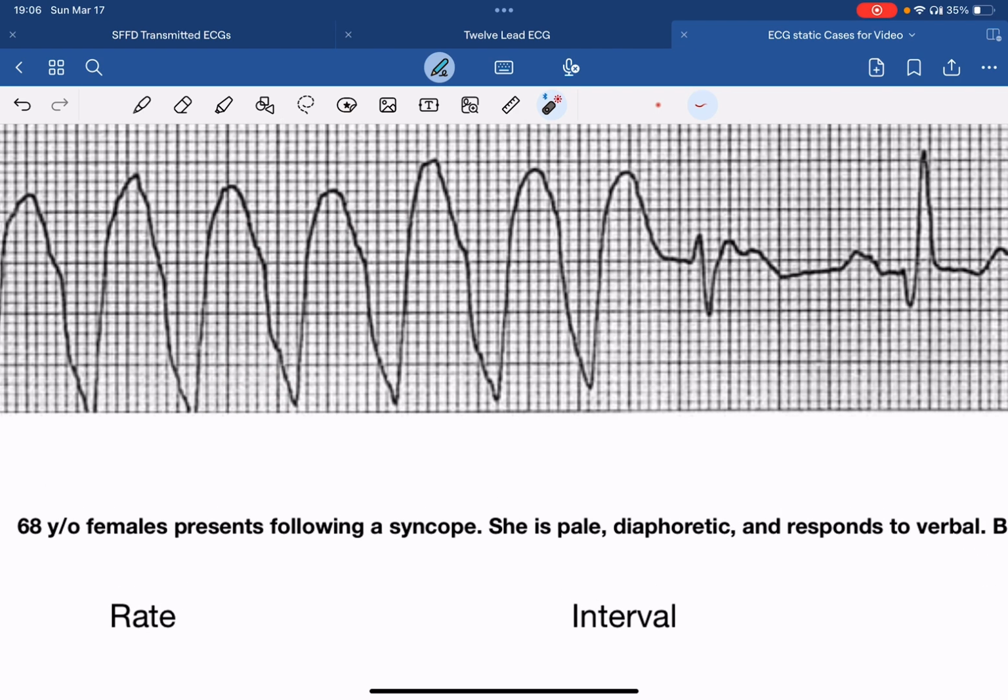If we zoom into the T wave, you'll notice there's a bit of a point right here where it veers off to the right at a slight slope, and that's going to be your J point. That's the section of the ECG where the QRS turns into the T wave. So for the purposes of this, our QRS is going to be down here, and our T wave is this section right here.